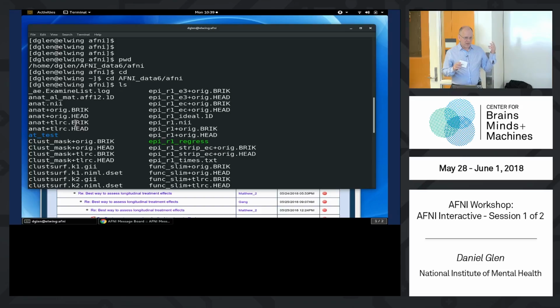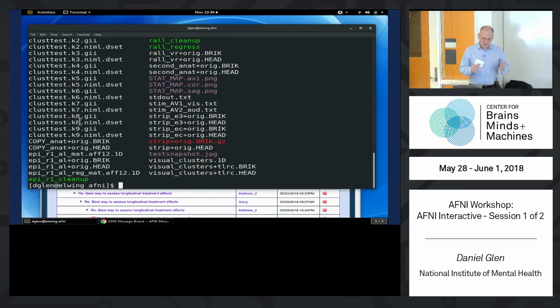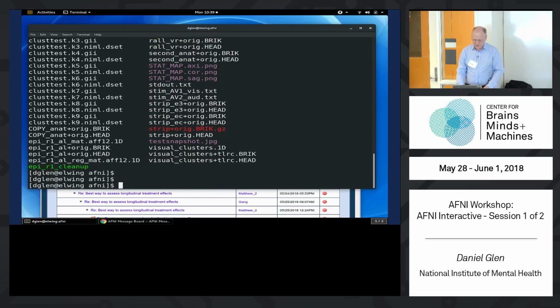We also read NIfTIs, so those would end in .nii or .nii.gz for the gzipped form. So different formats there. Anyway, generally you'll start AFNI in the directory where you have the data.